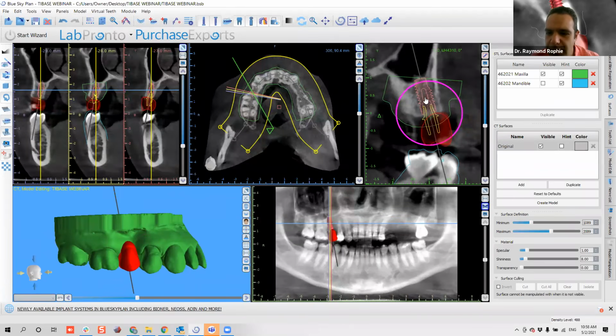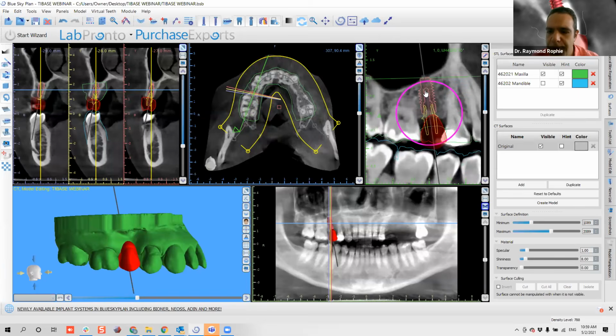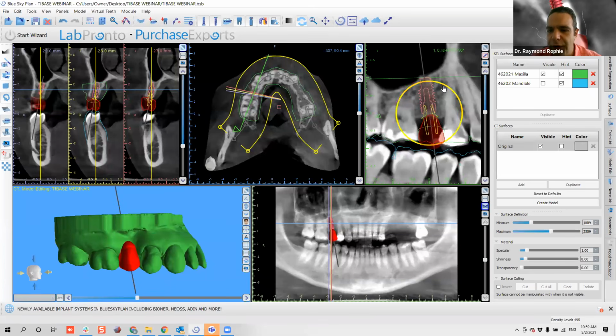As well, I think 10 millimeters here is way too long. So I will replace that implant, the length. So I'll right click, I'm sorry. Okay, so at this point in time, we've finished everything that we needed to do in the model editing panel. So what we do now is change modules.